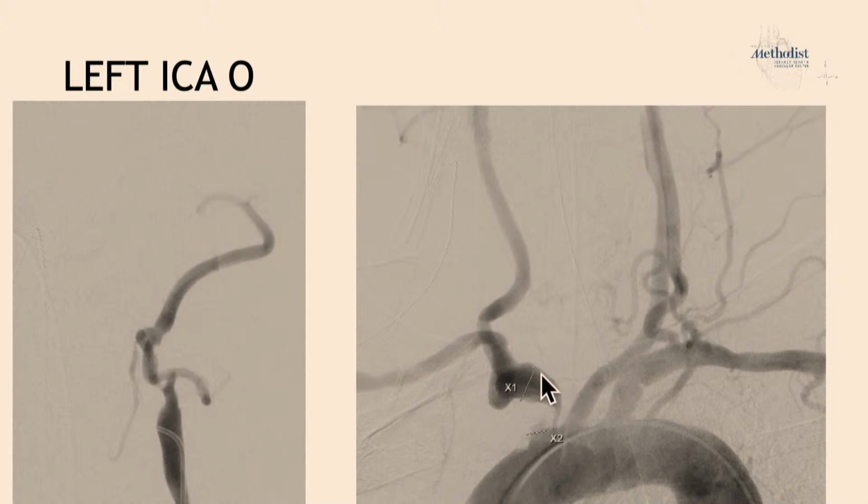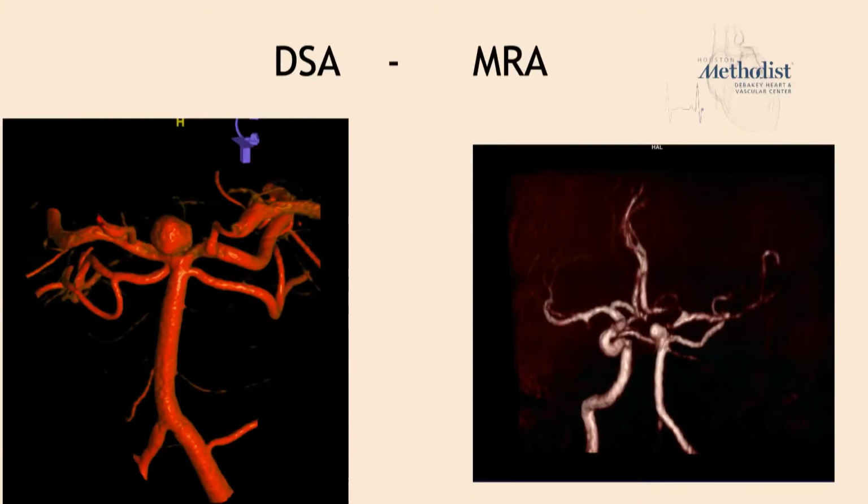Right. And here's an angiogram of that tight lesion of the innominate artery, and again the tortuosity of the subclavian. What we are using again is an MR, and actually what we will do is to try to rotate it so that you will be able to see these two vessels, and here's your right vertebral.